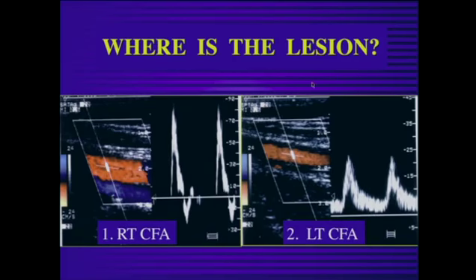So here's a little quiz for you. Here's a patient that presents with leg pain, and I'm going to give you two waveforms for your analysis, one from the right common femoral artery, one from the left common femoral artery. So where do you think the lesion is?